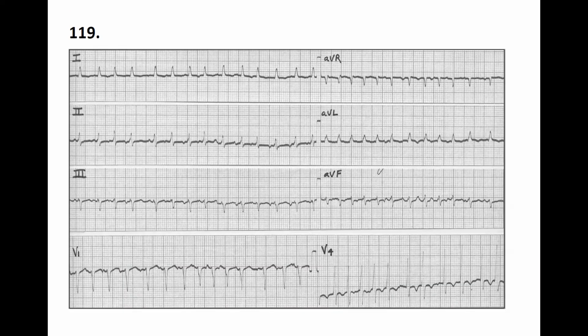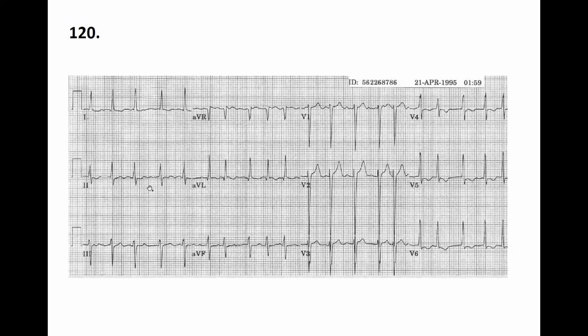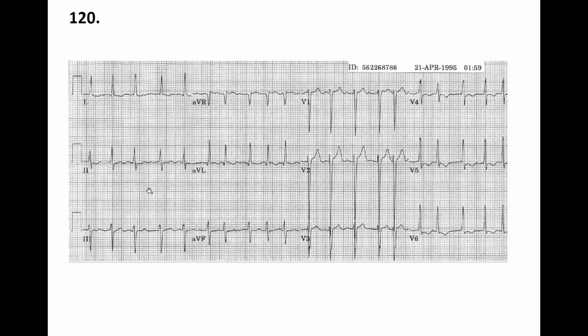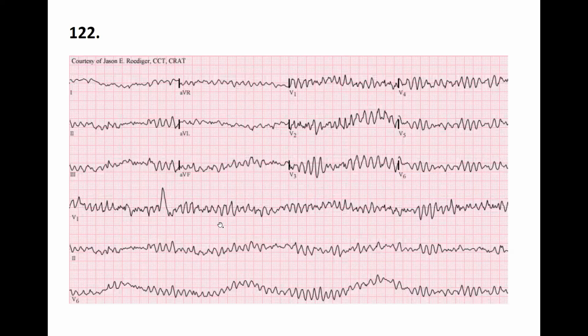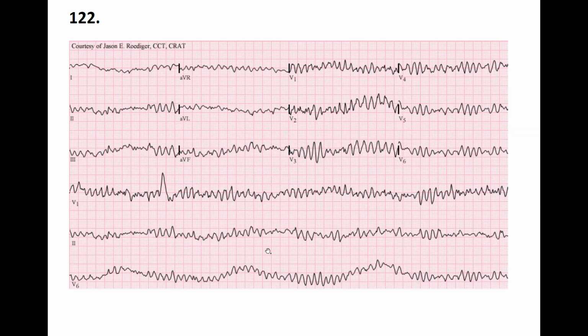Okay, if not, let's see, 120. Nope. 121. Can anybody tell me what this is? That's a ventricular flutter. Yes, that's a ventricular flutter. 122. That's a ventricular fibrillation. Yes, ventricular fibrillation.